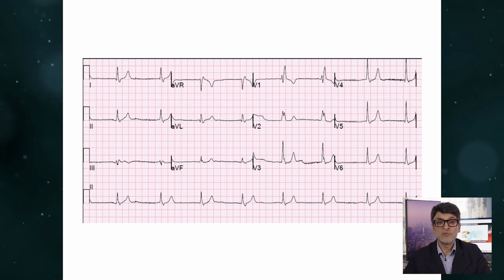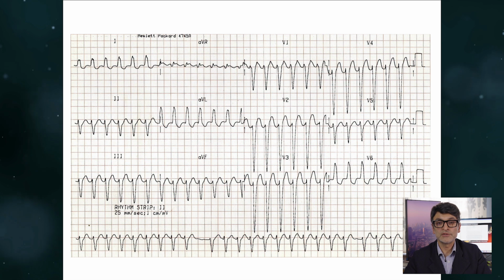Right, I'm not going to say any more for the rest of these ECGs. I'm just going to let you at home look at them and ask yourself, is this left or right? And if you don't quite get it right, start the video again and have another go. So is this left or right bundle branch block? It's up to you to decide.